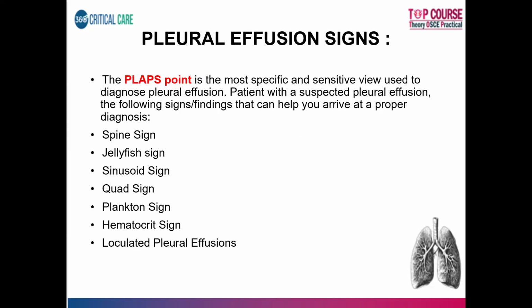So pleural effusion signs, we have discussed most of them. Jellyfish, plankton, most of them look alike. So when I'm talking to you about pleural effusion in the exam, whenever they give you a pleural effusion, the question they might ask is, how will you quantify a pleural effusion?